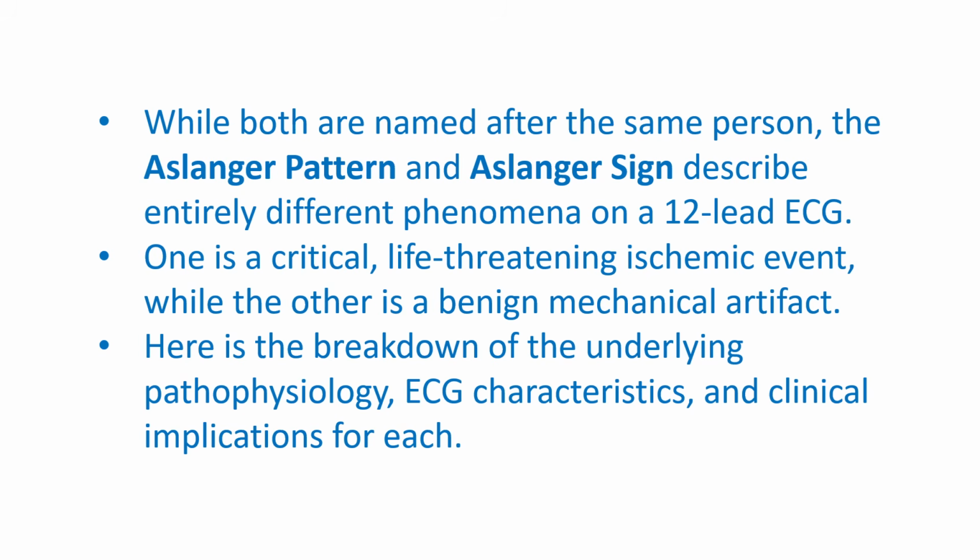While both are named after the same person, the Aslanger pattern and Aslanger sign describe entirely different phenomena on a 12-lead ECG. One is a critical, life-threatening ischemic event, while the other is a benign mechanical artifact. Here is a breakdown of the underlying pathophysiology, ECG characteristics, and clinical implications of each.